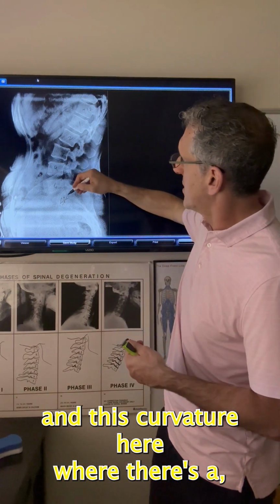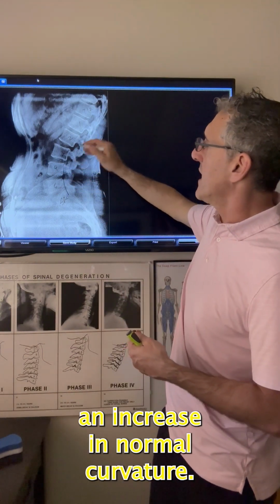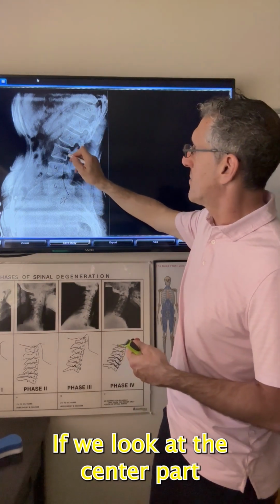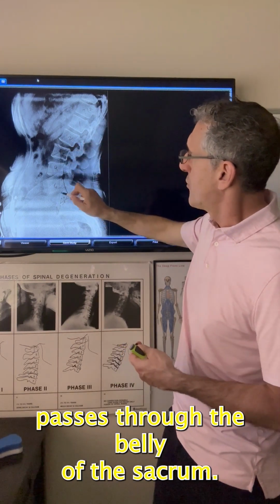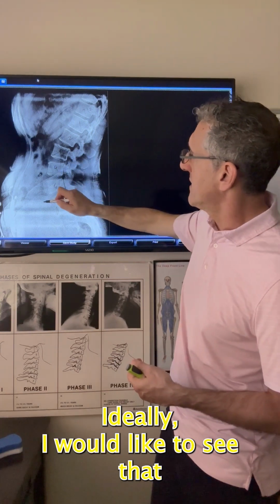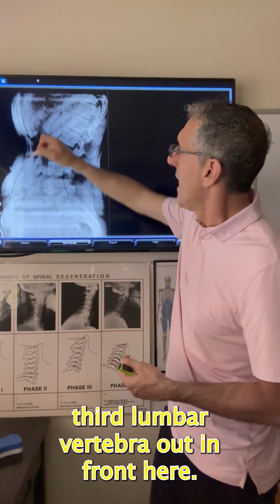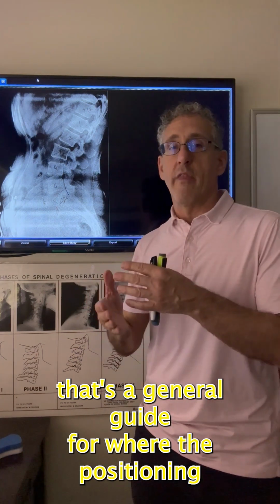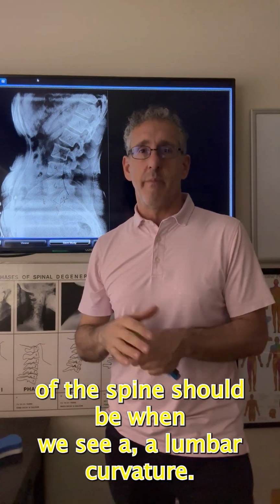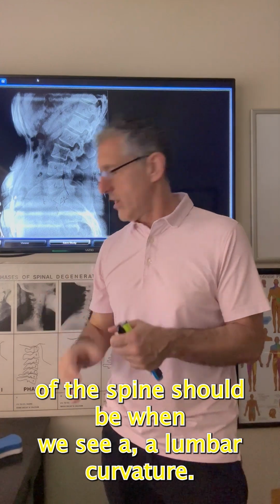And this curvature here, where there's an increase in normal curvature, if we look at the center part of this third lumbar vertebra, we can see that it passes through the belly of the sacrum. Ideally, I would like to see that third lumbar vertebra out in front here. That's a general guide for where the positioning of the spine should be when we see a lumbar curvature.